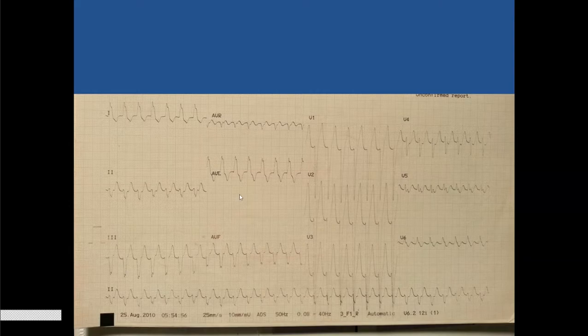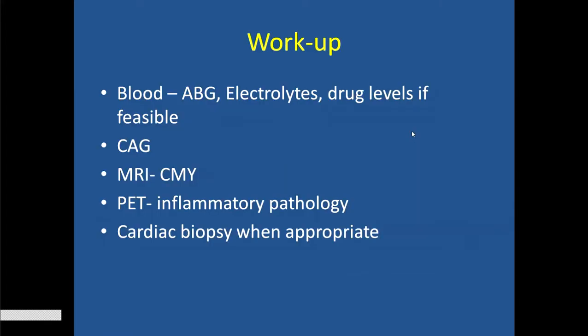This is actually a prototype of a Mahaim tachycardia. It's an atriofascicular tachycardia. These are two scenarios where you may falsely diagnose, or miss a diagnosis of, a VT following the traditional criteria. So fascicular VTs and this one, and also pre-excited tachycardias.